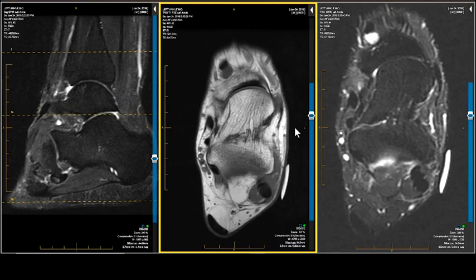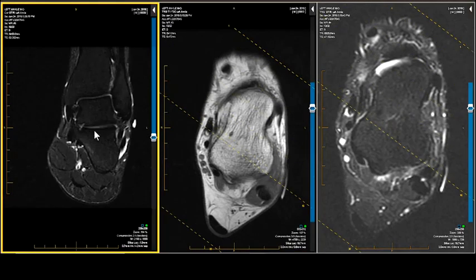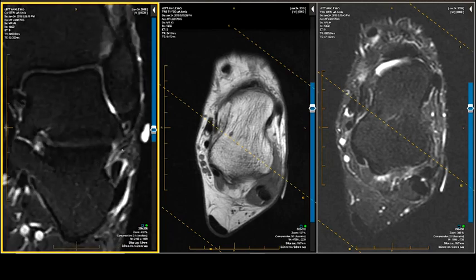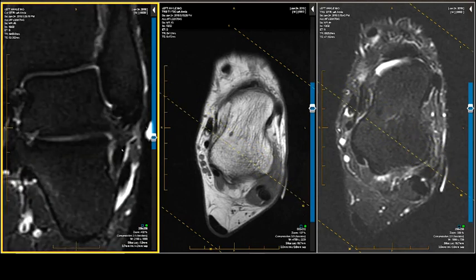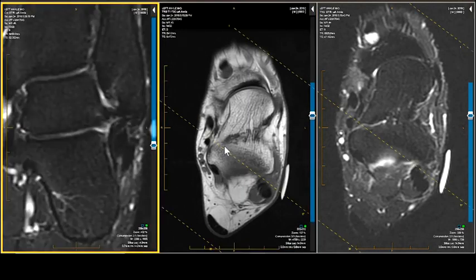Have we torn the calcaneofibular ligament? It's hard to tell. Maybe we need the coronal for that. Haven't. Little swollen but present. I'm going to blow it up. There it is. It's pretty straight. Granted, it's not easy to follow it all the way, but it's present. There are a few fibers of it as well, a little higher up. So it's intact, but sprained.